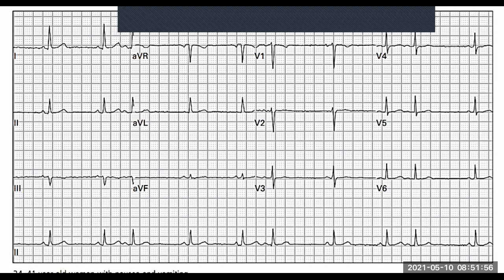Look, can you see that? Sometimes it's not as pronounced. It may come directly off from there, so it produces more of a camel hump. In fact, that's one of the signs of hypokalemia as well, the camel hump, U wave, things like that. But in this case, it wouldn't really be like that because this is a definitive P wave. In hypokalemia, you get that, and still a P wave after that. So that's one of the things you'll see. But it has almost like a camel hump appearance.